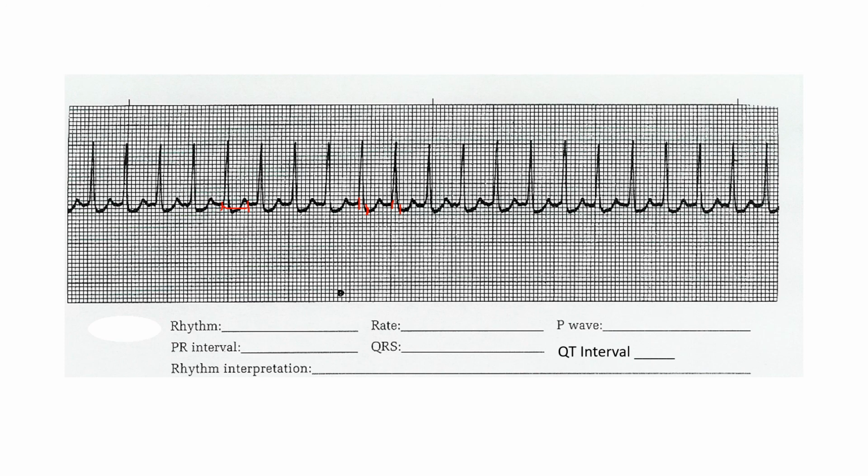So what is your interpretation? If you look in the back of the book, it says PSVT. Well, that would be fine if you could see where it starts and stops. What we're going to call it primarily is SVT.